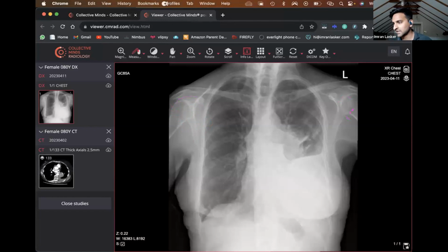It all looks very normal and uniform, because the bones have actually combined, fused together. So we don't have a young patient here. They're slightly rotated. I feel like they're rotated this way.